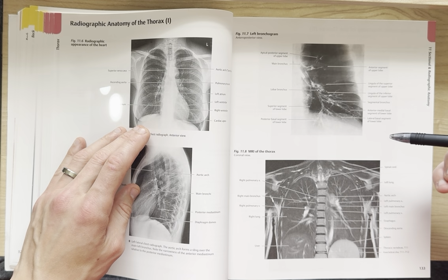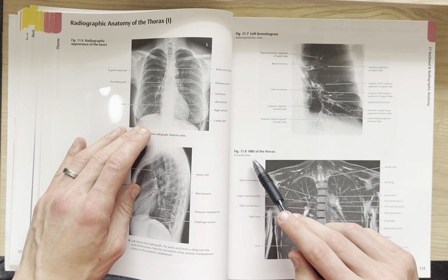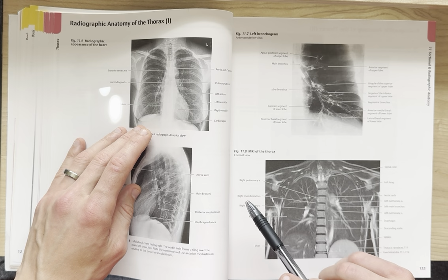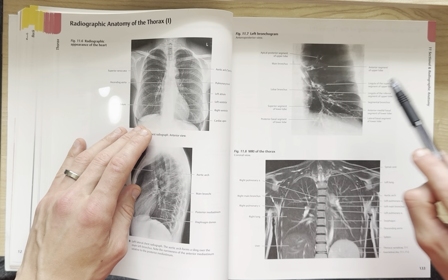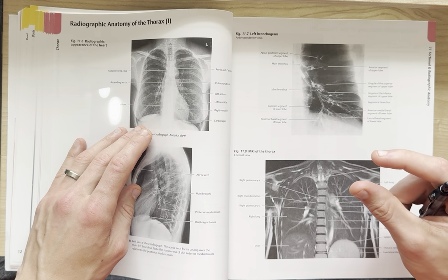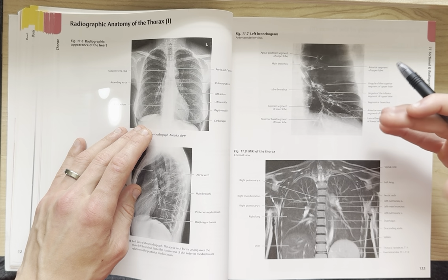Here we have an MRI of the thorax, which is pretty incredible. So an MRI, for those of you who aren't familiar, is magnetic resonance imaging. Basically, a very powerful magnet is moved around the patient, and it causes movement of the electrical particles within your cells, and the magnet impacts that, and it allows contrast to be drawn into an image.